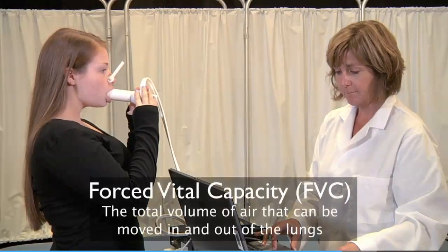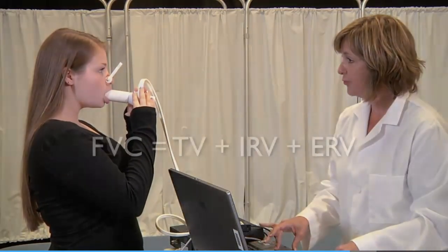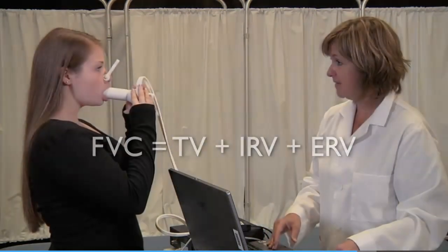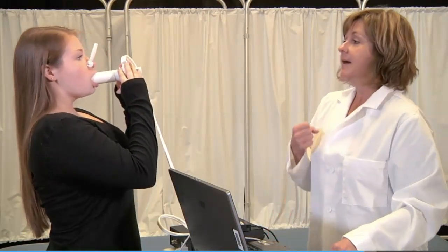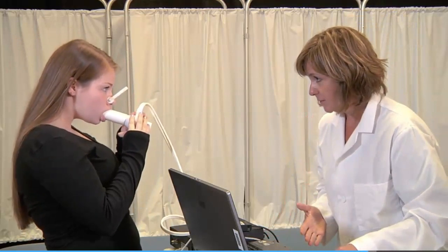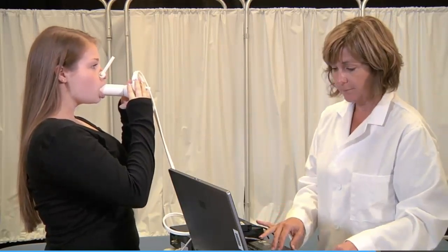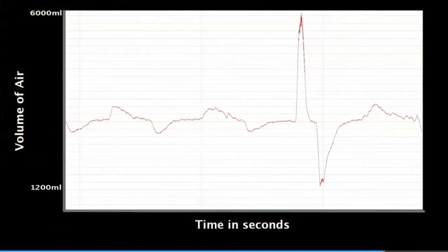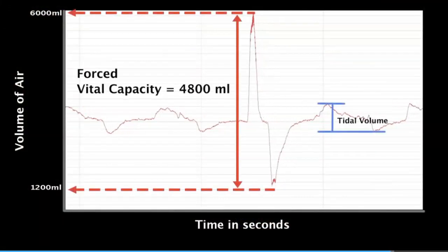The forced vital capacity is the total volume of air that can be moved in and out of the lungs. It is the sum of the tidal volume, the IRV, and the ERV. To measure the forced vital capacity, take the biggest inhalation possible, then exhale everything you can into the spirometer. The forced vital capacity is typically around 4,800 milliliters. To analyze the results, read the volume of air moved on the y-axis. The forced vital capacity is the same as vital capacity.